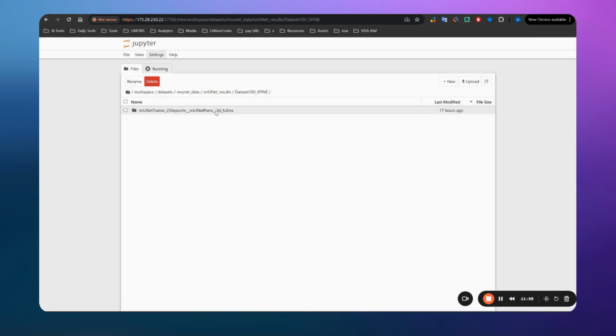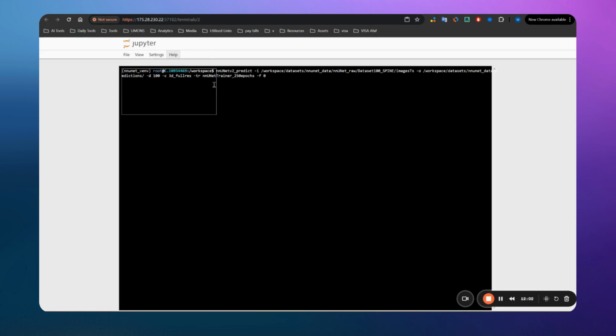For you, if this doesn't bother you, then you can leave it like this, but you need to specify these whenever you use the prediction or inference. For using nnUNet, you need to use these and specify them. Otherwise, you can change them, as I said, and it will be very easy to do. It's not a problem. You just need to delete some subfolders and make the whole folder the pointer. So you just give one folder, it will contain everything, and it will not care about the rest. But you need to change it.